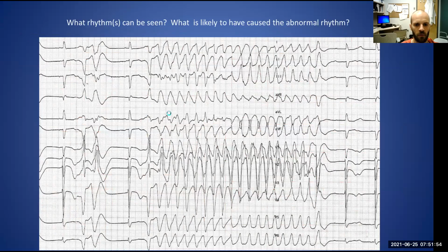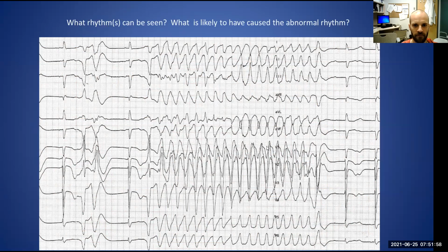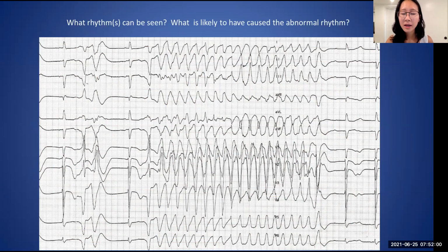I actually had one more question about the homework, the third one, if you don't mind pulling it back up. Let's go back up to that one. So the one with PVC. 1, 2, 3. This one. Yeah. So you said the last segment looks like long QT syndrome.